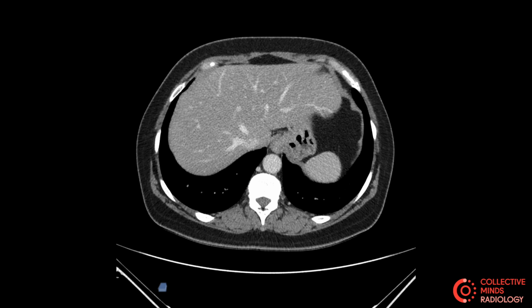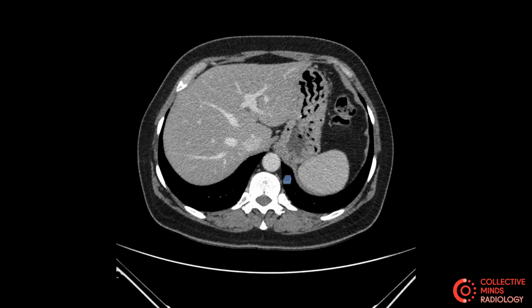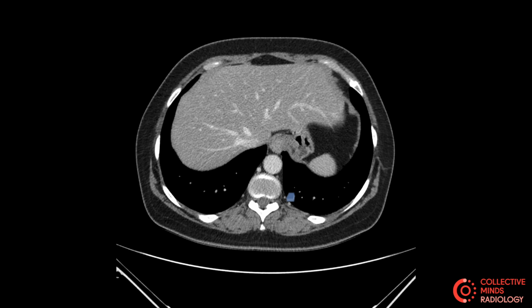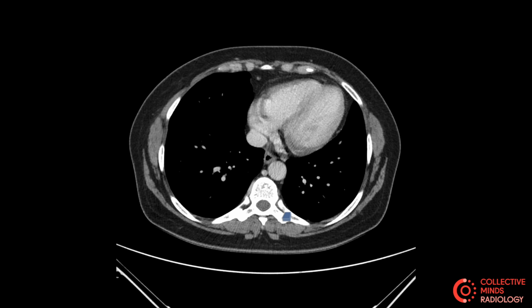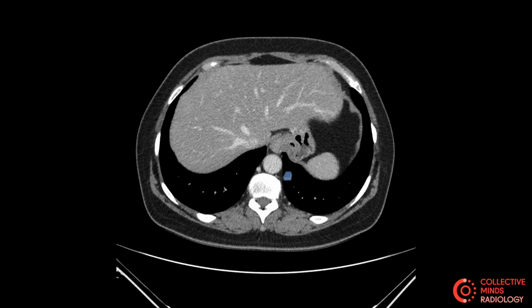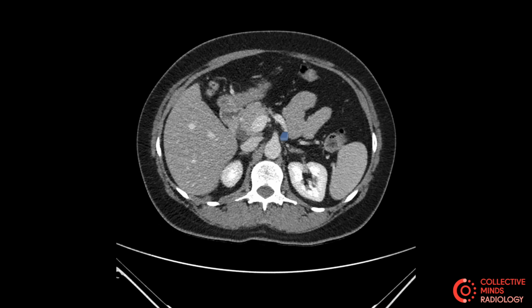Again, different from the last study, you can see that the table is sitting behind the patient, not in front of the patient. So this patient is lying on their back. Right, so now we've got those things out of the way, let's try and find the aorta. The aorta is sitting right over here. That's a big trunk-like structure coming from the thorax. This is the thoracic aorta, and as you follow down, this will continue into the abdominal aorta.